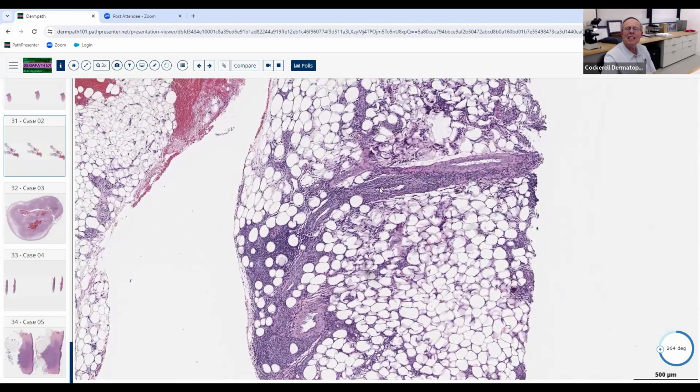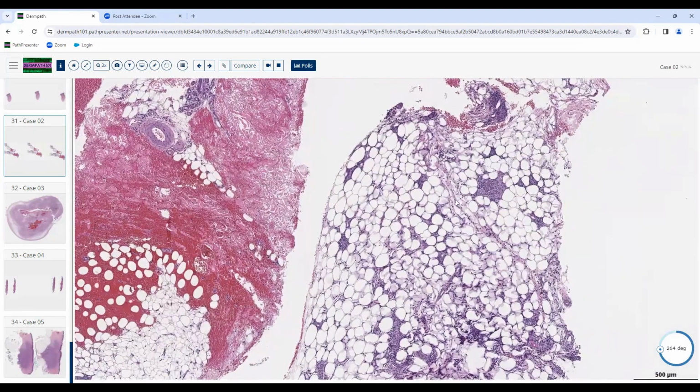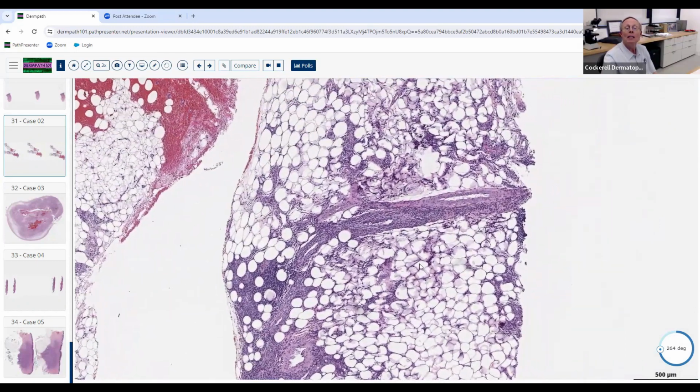If it is, it's just secondary inflammation around the blood vessels. I'm not sure it's really. Well, I don't know. Okay. So mostly lobular, maybe a little bit of septal too, but mostly lobular. No significant necrosis, maybe some fat microcyst here, but no massive necrosis, no vasculitis.